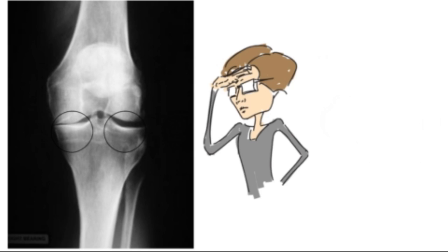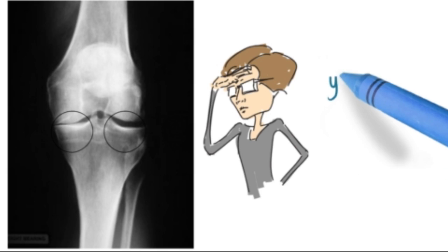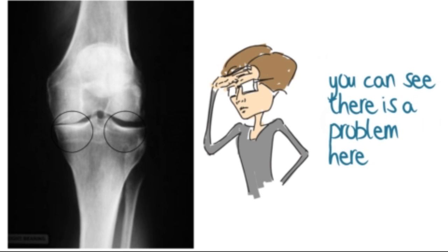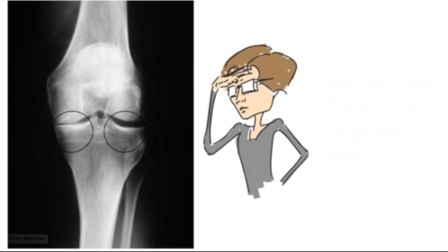In this particular patient, it's likely that the one meniscus is absent or damaged, possibly together with some deterioration of the articular cartilage, so that the bones have come almost into contact with one another. The doctor may simply report that there's a reduction in the gap between the long bones, and book a different imaging examination like an MRI scan to elucidate why. Or he might go further and interpret that as loss of the meniscus tissue itself.